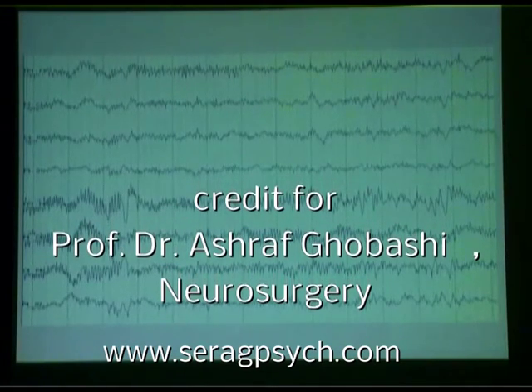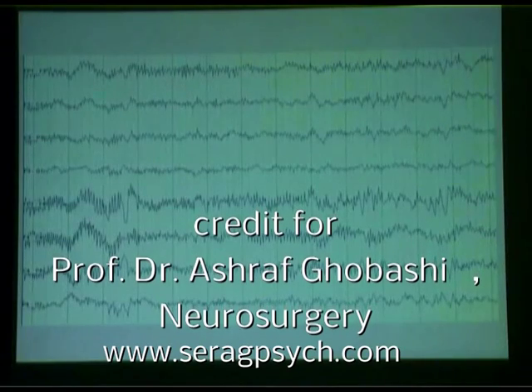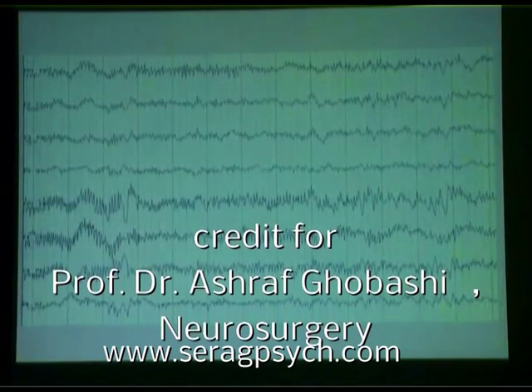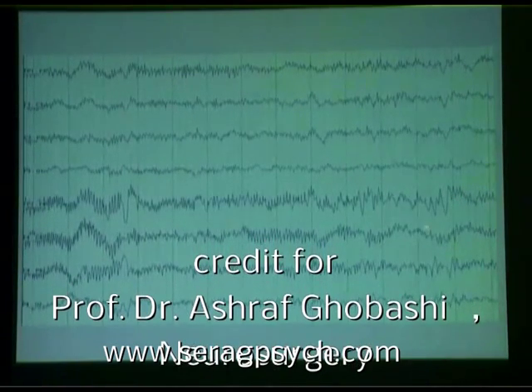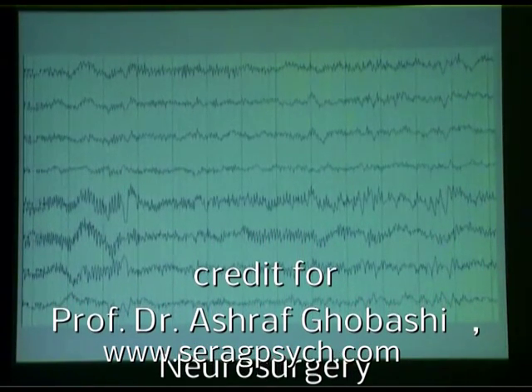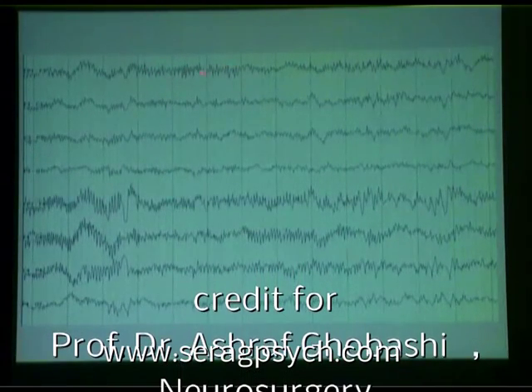Even if you missed the beginning of the recording, here's how you teach yourself EEG. You read the EEG and suddenly you say, gee, something is happening here. What's going on? And you'd say, I guess it's a seizure. And then you'd go back and look at the beginning. That's how you teach yourself. And notice that it's gone over here to the left frontal polar region a little.